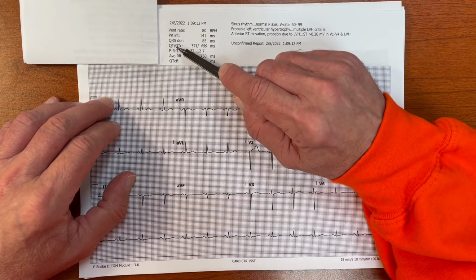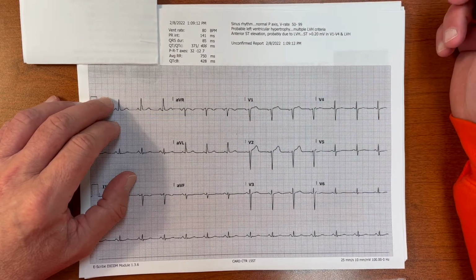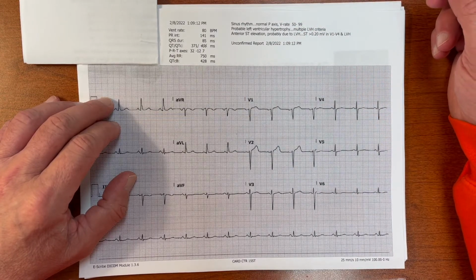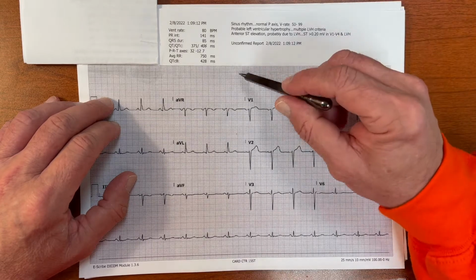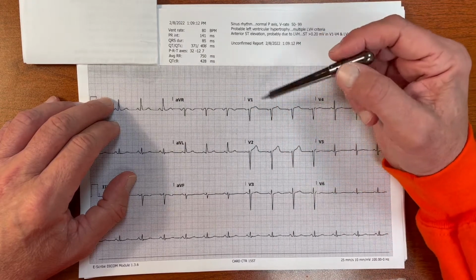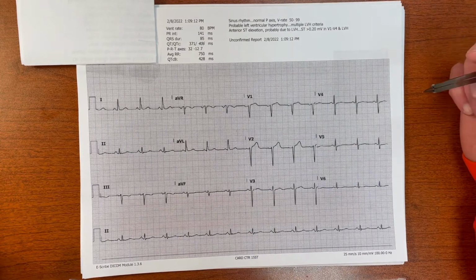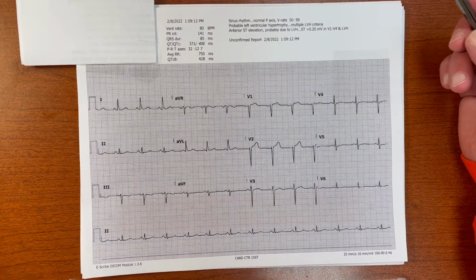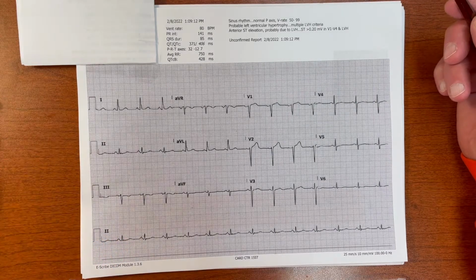If you look at any day in the heart station where we're reading EKGs for the whole medical center, on any given day, I will promise you 35 to 40% of the EKGs, as screened and read by the computer, are reported to have a long QT syndrome, when in fact, when we manually measure it, that's not true. So obviously there's a problem with the program worldwide in these computers being able to measure a QT interval. All right.